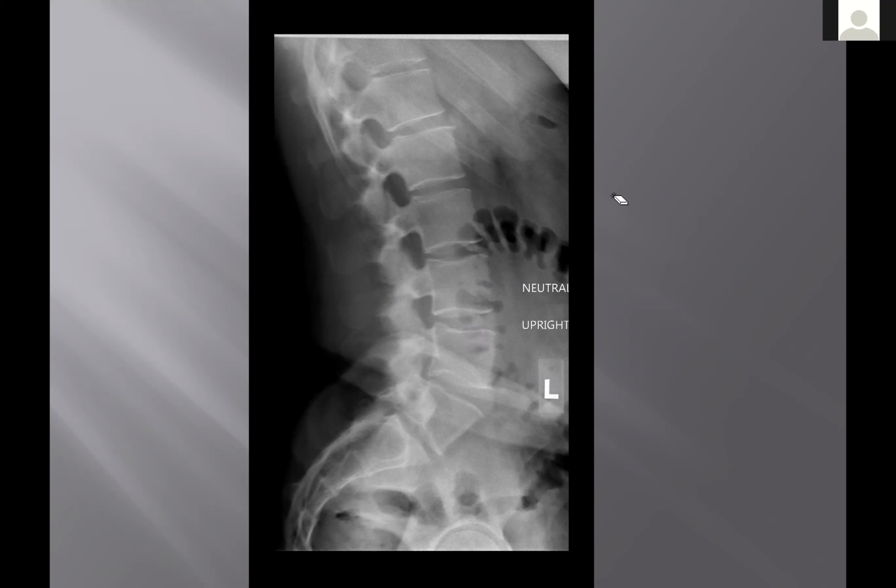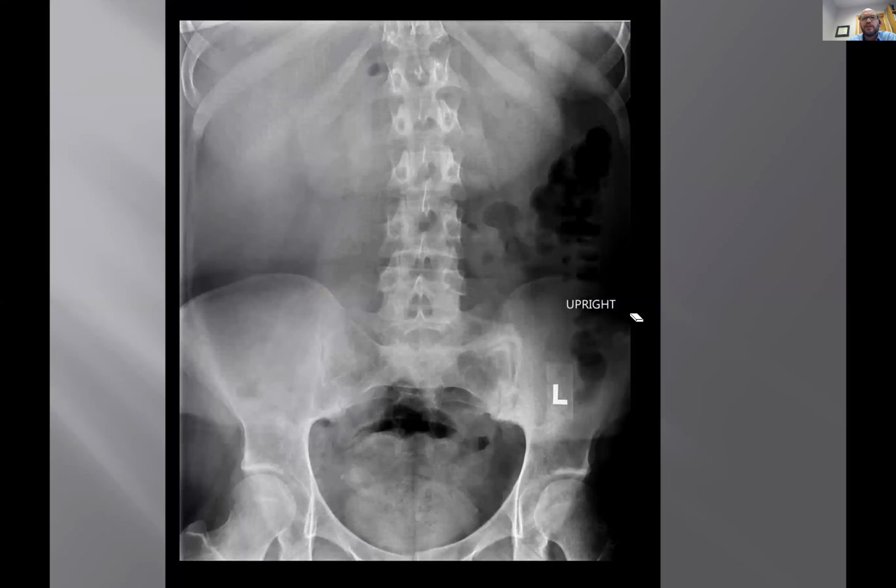Posterior aspect of the L5 vertebral body. What level? L5. Okay, I agree that it's kind of in here, and I'm going to give you that. Your brain's looking at the right spot. So here's the AP view. You earned the AP view. There it is.